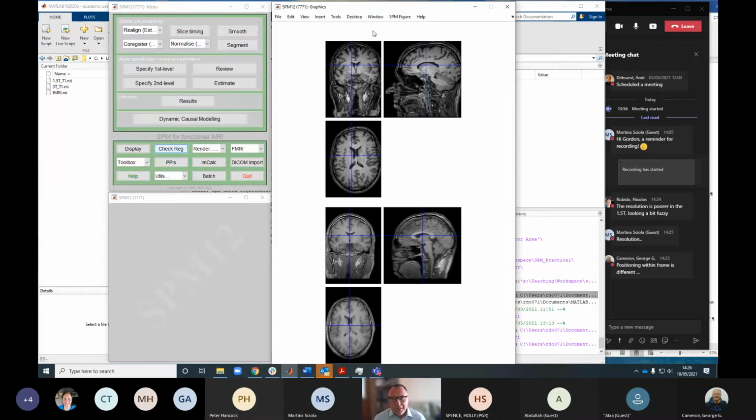And there's a better contrast to noise ratio in the 3T image. Contrast is the difference between the grey matter and the white matter in the brain. So the grey matter on the outside, that's the bit that does all the work. And then the white matter on the inside, that's the cabling. This is a structural scan, so we try to design these structural scans to give us the biggest contrast difference between the grey matter and the white matter.